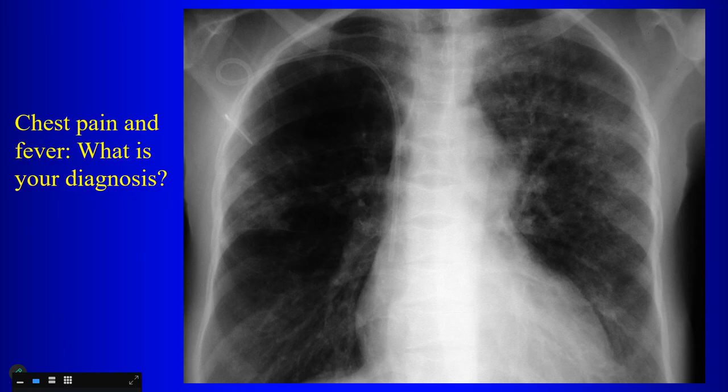Is that the only place? Where would that be? What lobe? Yeah. So why do you say upper lobe? You don't know how to describe a straight line, yeah, right. It seems to be bordered by the minor fissure, right? So I would place it in the right upper lobe.